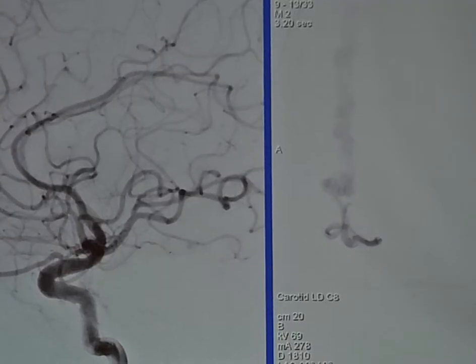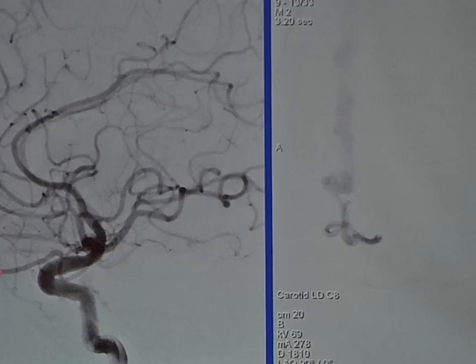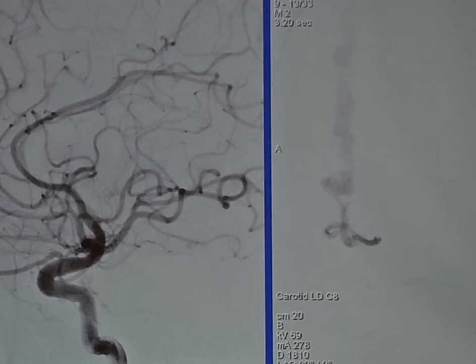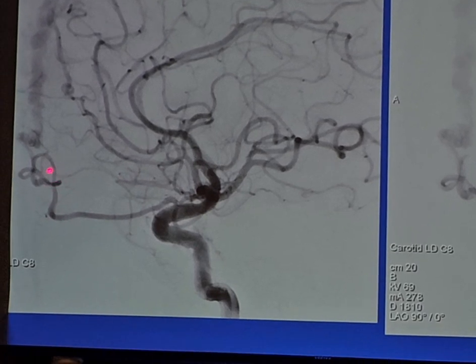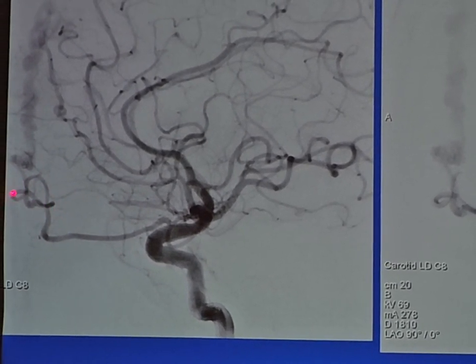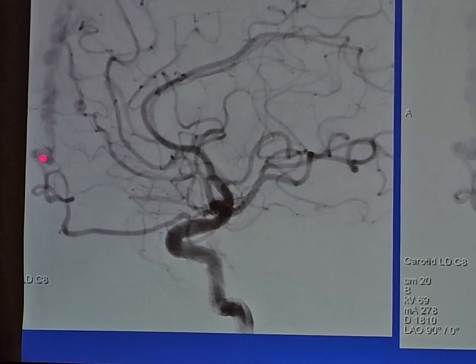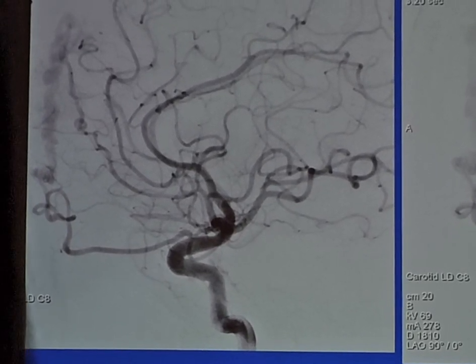So let's look at the angiogram. I'm just putting up one picture. And again, here we've got ophthalmic artery, ethmoidal, coming up to the cribriform area. Tell me when we get to the fistula. So we got ophthalmic artery. All right, good. So that's our target, right? If we're going to treat this.